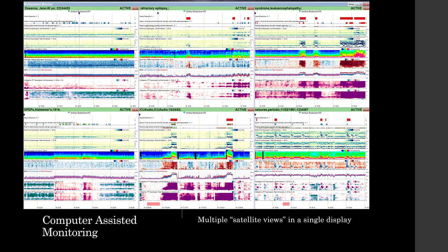So here's something that you can use to provide a live, longer duration view of multiple patients as they're being monitored, all on a single display. So this is not replacing the live streaming EEG and video. You can think of this as a rear view monitor for each patient. So here's a display of 6 different patients, and in each we can see seizure detections.